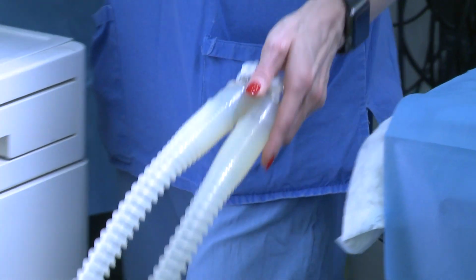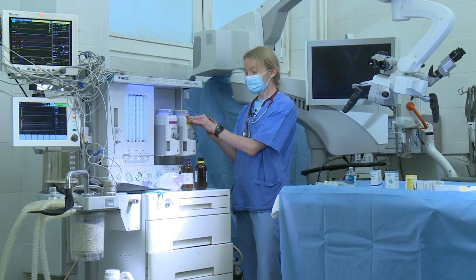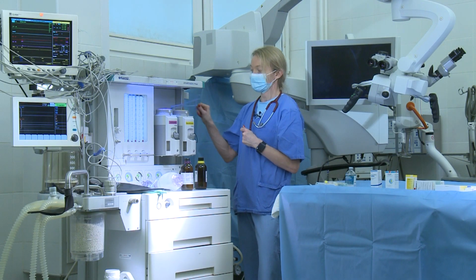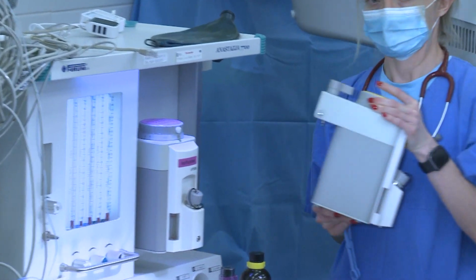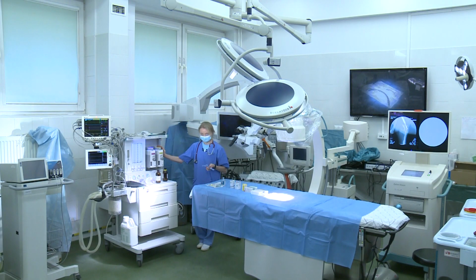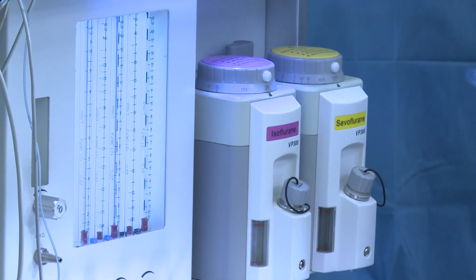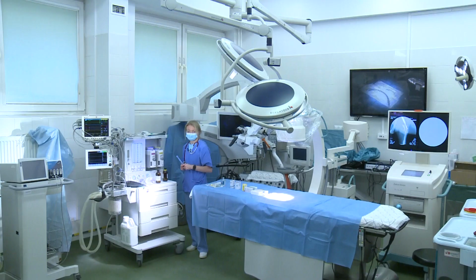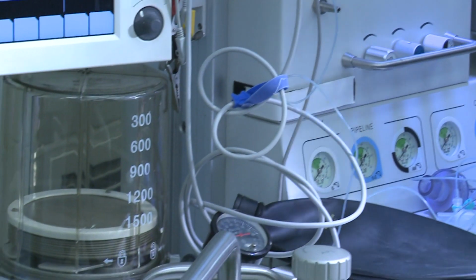And now, three words about how it works. Each anesthesia device is equipped with a universal bridge, which allows us to connect and disconnect each type of vaporizer. It depends on what our patient needs, in what kind of condition our patient is, and what kind of surgery we are going to anesthetize for. So this is the heart of each anesthesia machine. These are the vaporizers. The next element, which is obligatory in each anesthesia machine, is the breathing circuit.